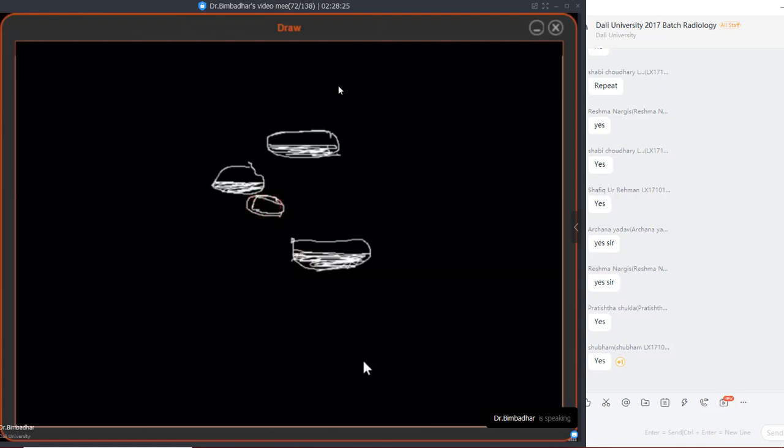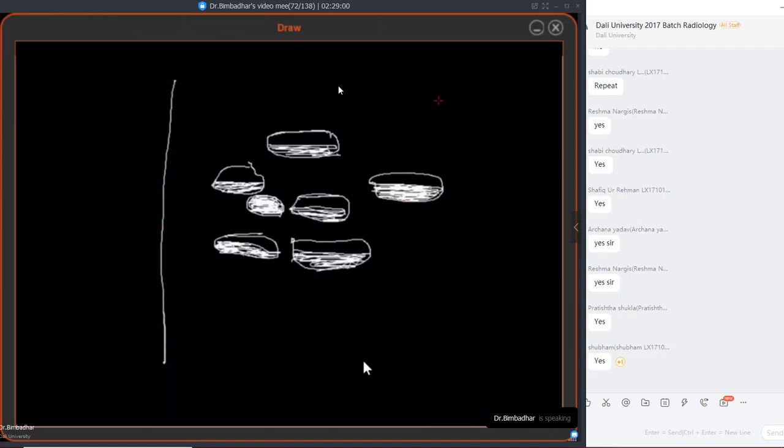There is nothing else present down here, and you see there are bowel loops all around that region. This one will look completely white because it is not moving. All other bowel loops, which are completely normal and undergoing normal peristalsis, will eventually form a region like this. So your diagnosis of intestinal obstruction is made by observing multiple air fluid levels in the abdomen. Simple.